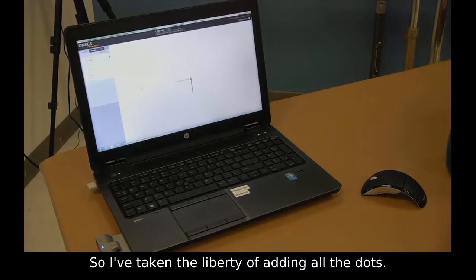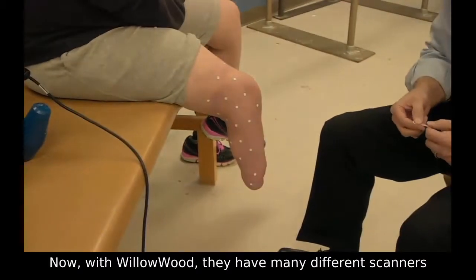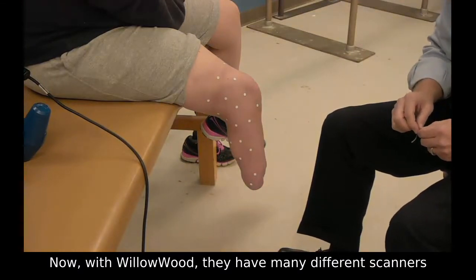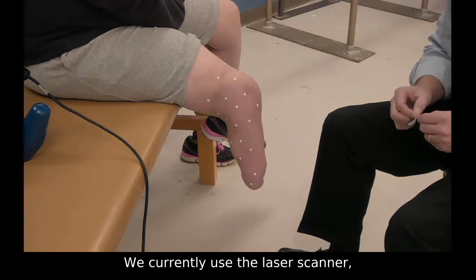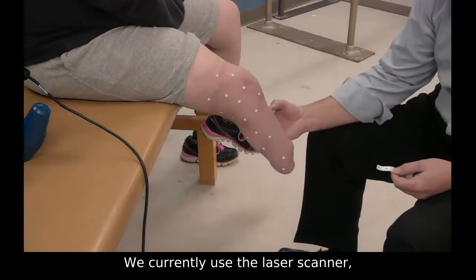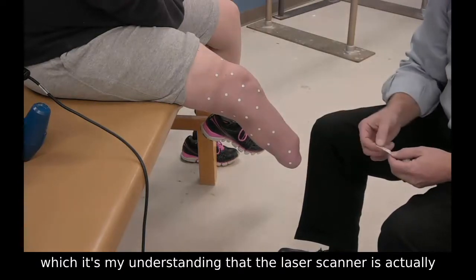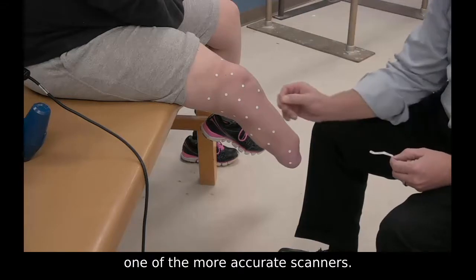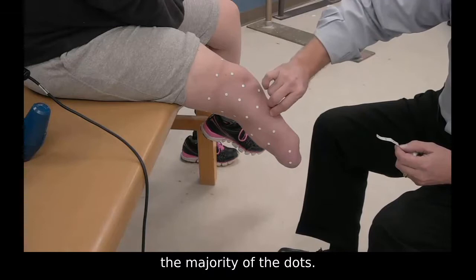So I've taken the liberty of adding all the dots. Now with Willowood, they have many different scanners available today. We currently use the laser scanner, which it's my understanding is actually one of the more accurate scanners, and I've taken the liberty of adding the majority of the dots.